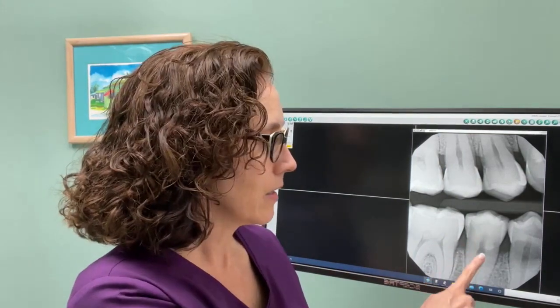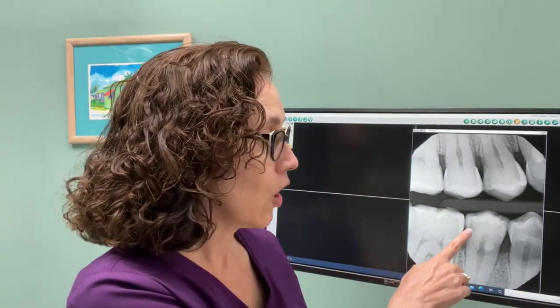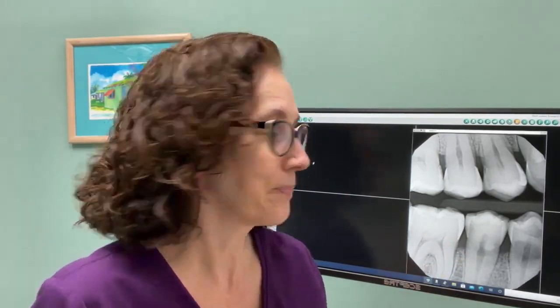This dark area in the middle of the tooth is actually the nerve of the tooth. So the X-ray affords you the ability to look inside to see how far that decay goes, or how close to the nerve of the tooth that decay is.